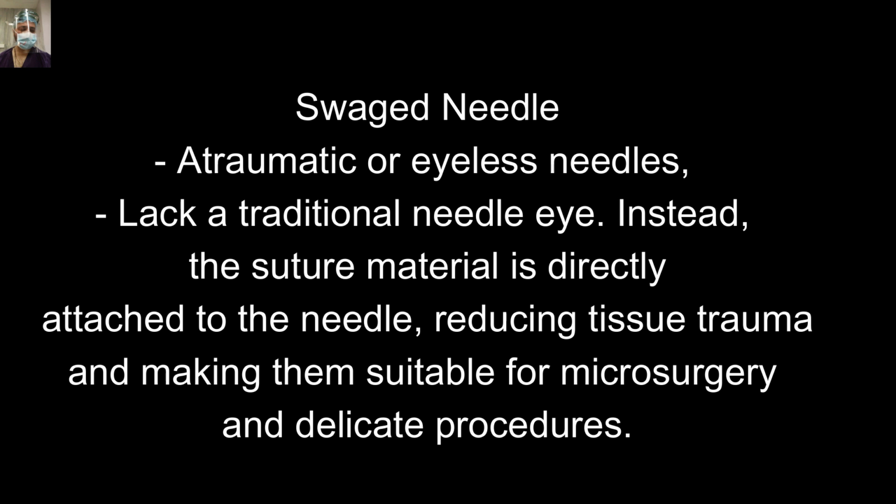As I said, these swaged needles are atraumatic and eyeless needles, lacking a traditional needle eye. Instead, the suture material is directly attached to the needle, reducing tissue trauma and making them suitable for microsurgery and delicate procedures.